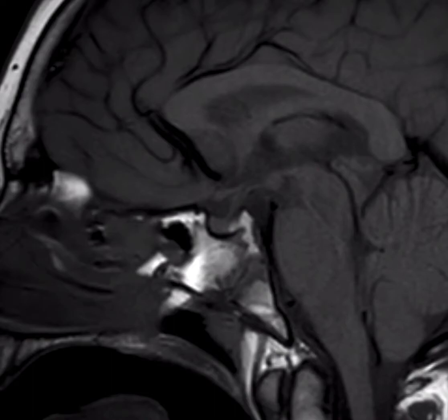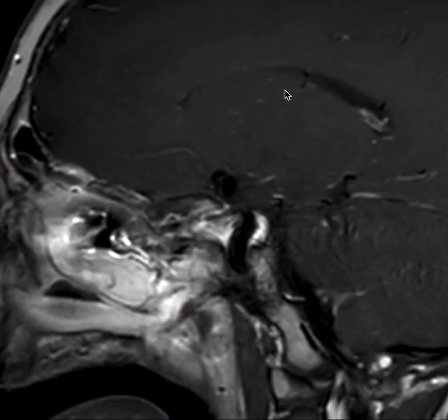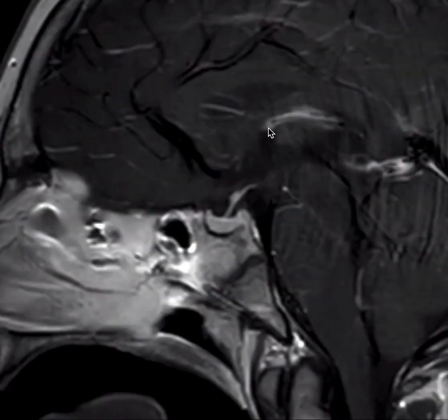Now that we've discussed the midline structures here on this non-contrasted T1 weighted sequence, we're going to move to a post-contrast sequence, also in the sagittal plane, to show how these structures will enhance. After the IV administration of gadolinium-based contrast, we can observe the normal enhancement pattern of the midline structures of the brain. I'll start here on this sagittal section and first point out the choroid plexus, which we're beginning to see here. As I scroll toward midline, we'll see the choroid plexus as it lays along the floor of the lateral ventricles. It will go through the interventricular foramina of Monro here, and choroid plexus will also extend along the roof of the third ventricle right here.